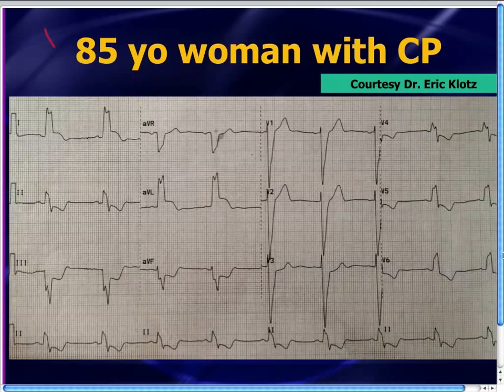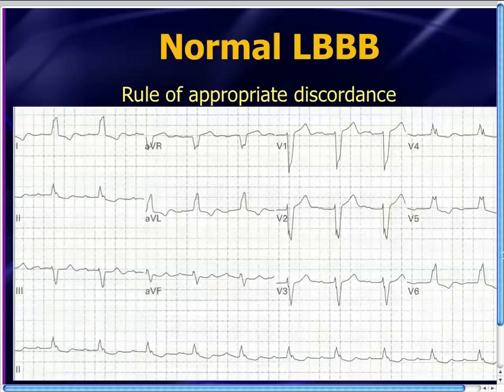It's a left bundle branch block pattern, and so, well, we're pretty much done, right? I mean, you really can't read ischemia in the presence of a left bundle. Well, of course not. Of course that's not true. If you have not been listening to any podcasts or any videocasts thus far, you may be under that misconception, but this is our opportunity to once again talk about left bundle branch block and how sometimes you can very reliably read ischemia in the presence of a left bundle.